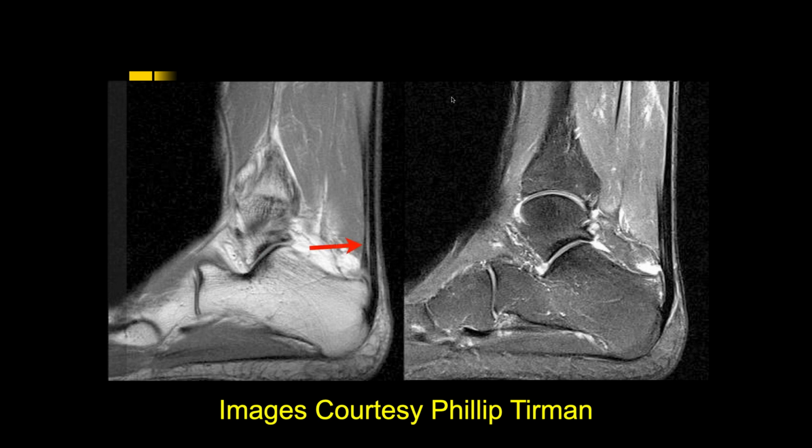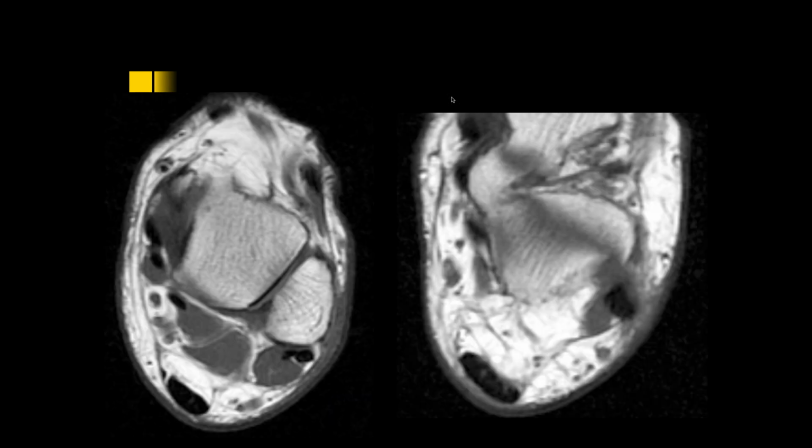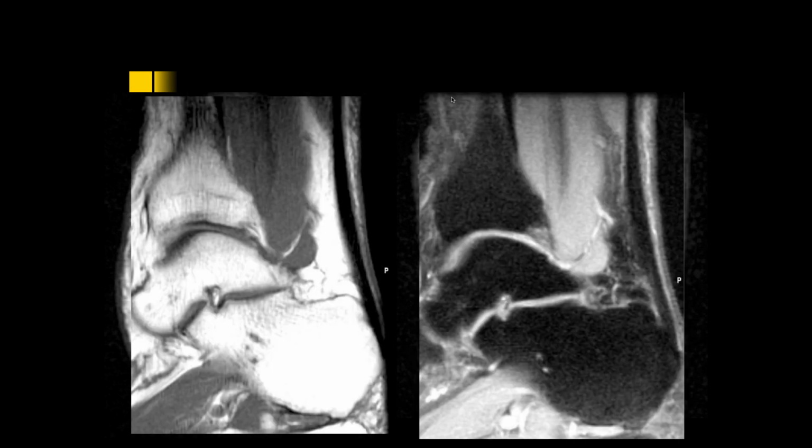Also, John, is the calcaneus on a right angle, or is it just the way it's positioned? Yeah, it's just the way it's positioned in the skin. Okay.